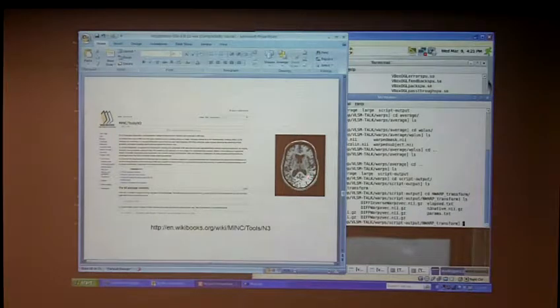This big bright spot at the back here, while the rest of it is sort of darker up here. That just happens to be a function of the 8-channel coil that we're using to acquire our scans, and that produced this sort of artifact that we're seeing here. So using N3, we can normalize this inhomogeneity from our scans. And then, again, you get an additional benefit from using the intermediate template once you've done that, to improve the overall warp.